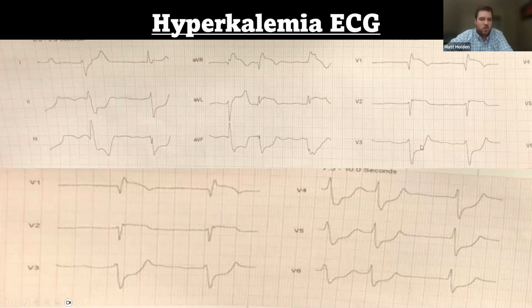You see these little pointed T waves right here, but you will see some depression in 2, 3, aVF, some reciprocal elevation in aVL. You'll see aVR and V1 also have elevation. This patient had a potassium, I believe, of 7 to 8. And like I said, they were not given the proper treatments. They were brought to the cath lab, and then they realized, oh no, this is not very good.